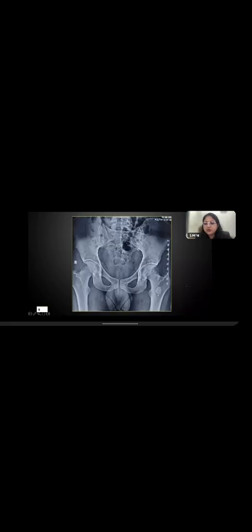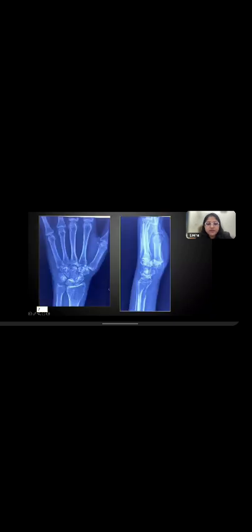Someone is asking, Dr. KP, Shruti is asking me, why not enchondroma? Enchondromas are lytic lesions. They have chondroid matrix. Okay. So chondroid matrix will always have ring and arc type of calcification. I have enchondromas as examples in the cases. So just hold on, just go on with me and you will understand why it is not enchondroma. Okay. Typical appearance of enchondroma I'll show you. Now see case 7. What do you think it is?